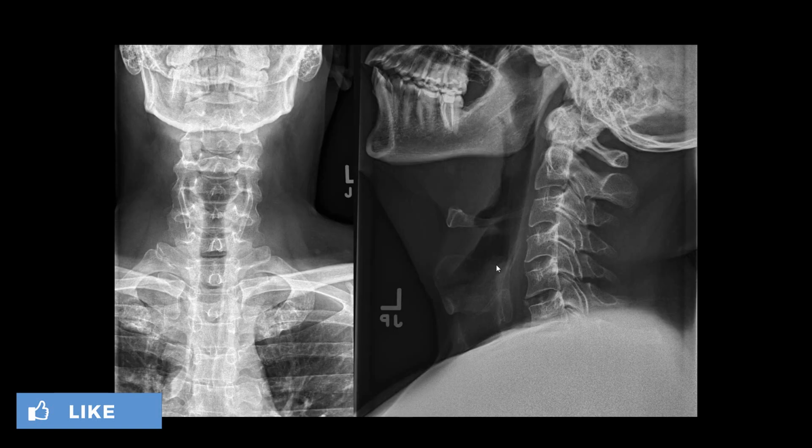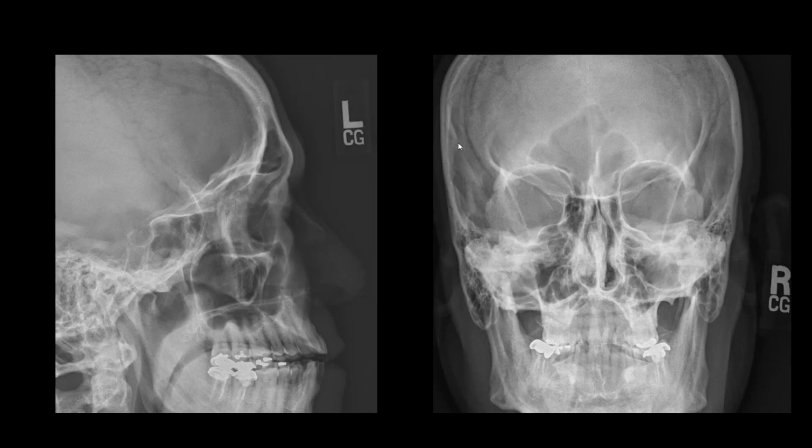Going to neuroradiology imaging, we see the gas within the trachea. We see that the fat in the subcutaneous soft tissues is gray, lighter gray where muscles are involved, and cartilage and osseous structures become whiter. The cortex is always whiter or more dense, and then foreign bodies are very dense.